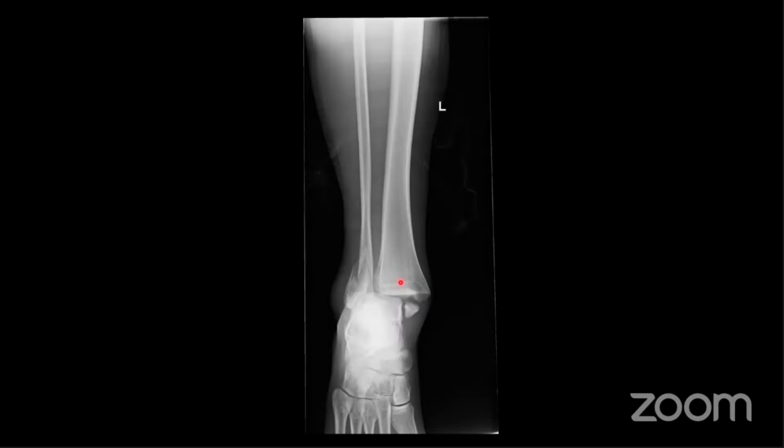But basically, I'd call orthopedics and tell them about this, and they'd probably ask to do a CT for operative planning. Yeah, call ortho, exactly. But yeah, so you need to do a knee X-ray and also look at the lateral to look at the posterior aspects of the tibia.